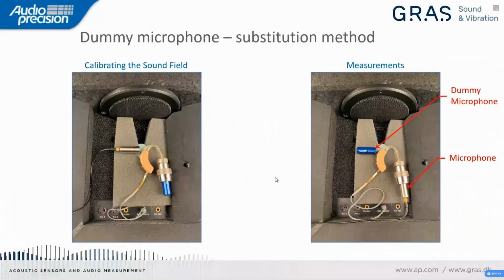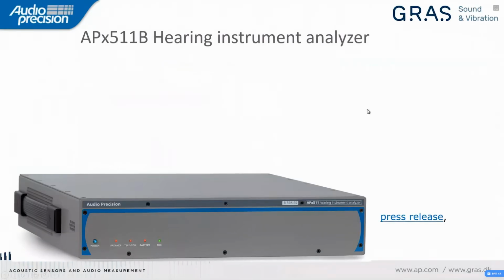And this keeps the sound level at the same level, because as you can imagine, it's a very small test space, and it's important to control the sound field so that we get an accurate setting of the sound. So that's the reason for the dummy microphone.